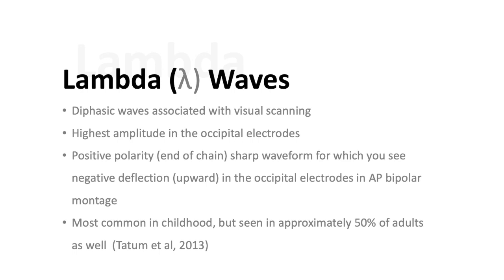They're seen most commonly in childhood, but they're also seen in approximately 50% of adults if there is visual scanning captured during their EEG. This was described by Dr. Tatum, my main mentor.